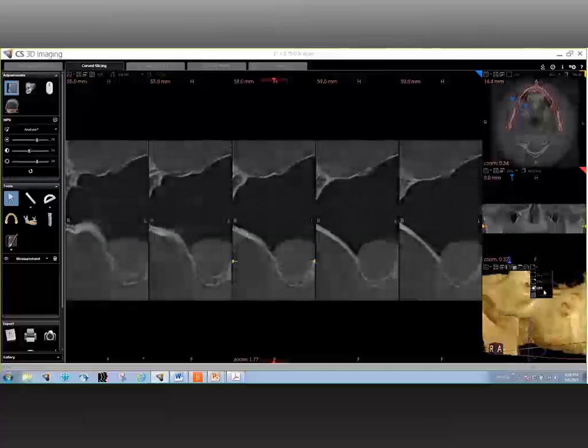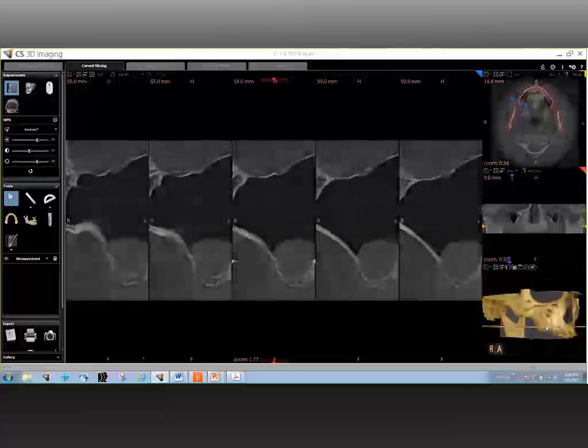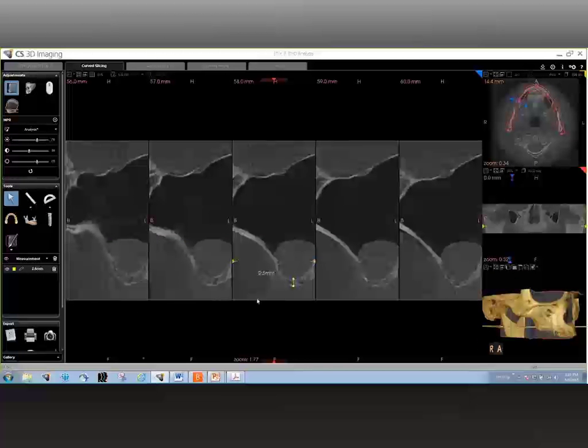Now you can notice over here, and for a second let's ignore the pathology that is sitting in the sinus. You can notice how the ridge is almost non-existent, and it's probably as thin as it can get. And you can even notice that there are probably a couple of breaches on the ridge which communicate into the maxillary sinus.